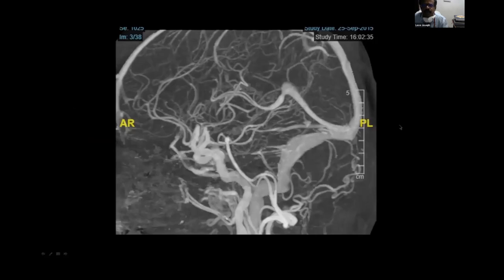Okay, what is the problem in this image? Anybody? Both arterial and venous phases are equally opacified. Yes. If your timing is wrong, if you are a little slow, you will get a beautiful venogram. But your aim is to get an arteriogram. And for the same reason, you should give some idea about the hemodynamics of the particular patient. If the patient has heart problem, valvular heart disease, low heart rate, cardiac output is very low, you are feeling the pulse very weak, please mention it. Accordingly, the timing should be slightly altered for the individual patient.